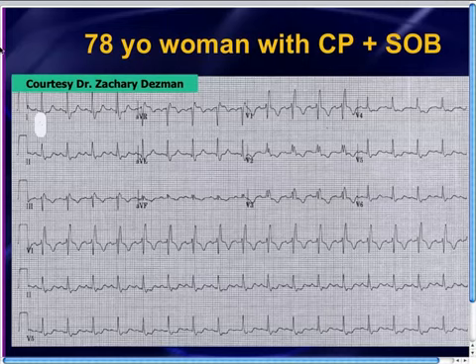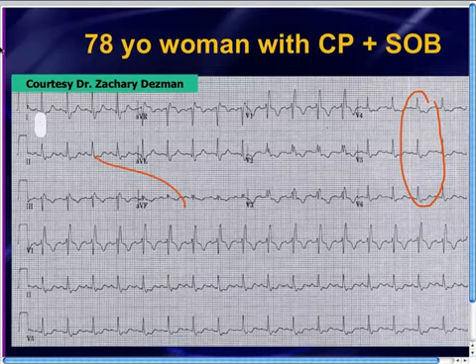This patient has a sign of right heart strain. In fact, it has a full-blown right bundle branch block pattern. There's that big RSR prime in lead V1. You'll also notice that there's a little bit of ST depression in this case. Now, it's normal to have ST depression in right bundle branch blocks in V1, V2, V3, but what's abnormal, there really shouldn't be ST depression in other leads in a right bundle branch block. There's ST depression in those leads there.